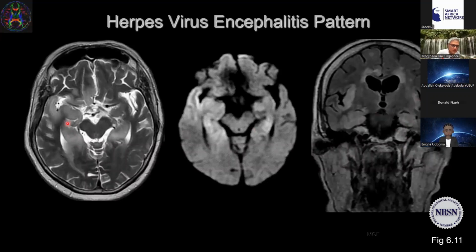On the T2 weighted MR image, sometimes you can make out swelling and high signal intensity, but the CSF high signal intensity is very glaring, and sometimes we can't see the high signal, especially if the lesion is small. So FLAIR suppresses normal CSF and allows us to see the high signal intensity a little bit clearer.